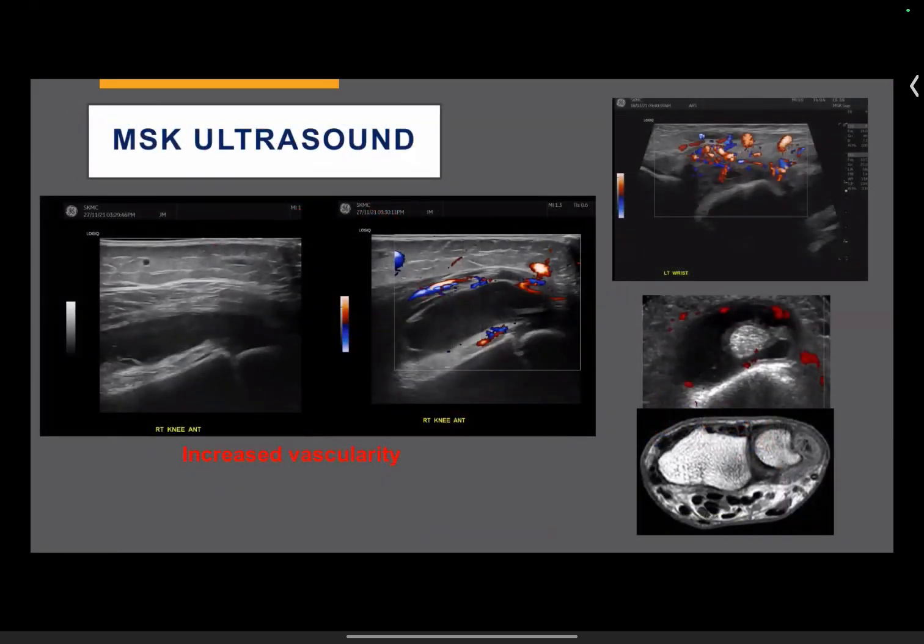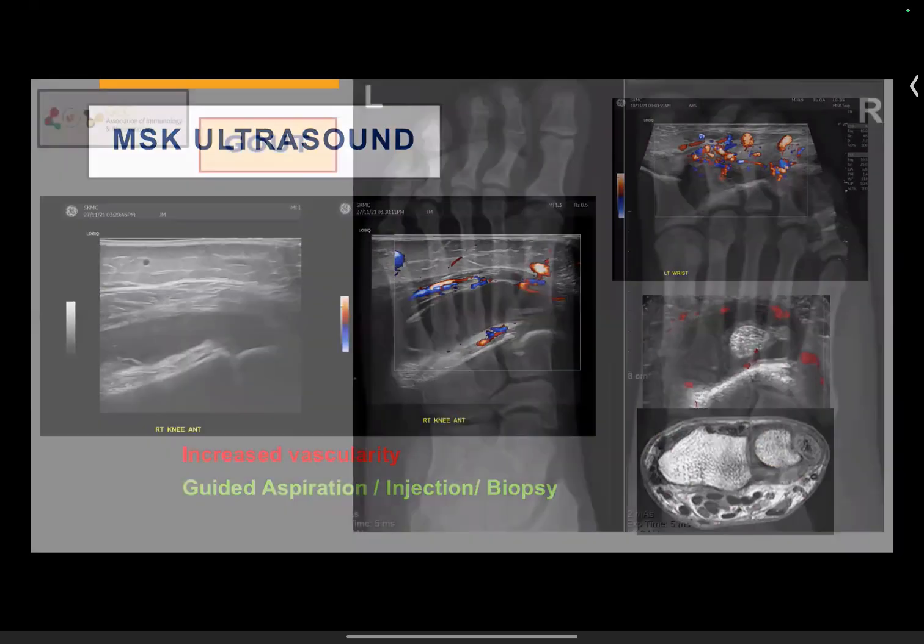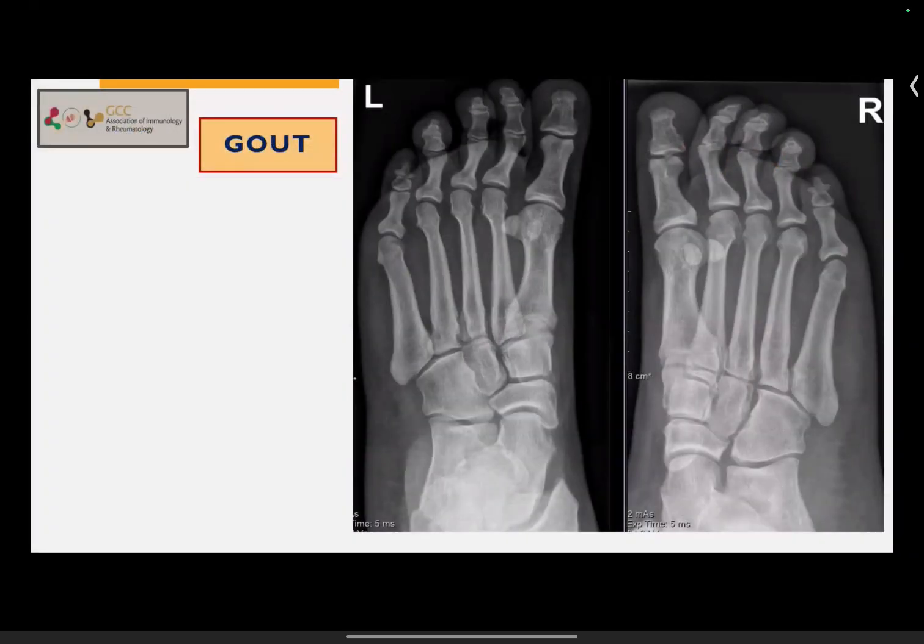Again, just showing you a few more examples there. All right, okay. I put gout there. I just presented this in one of the rheumatology meetings. The use of ultrasound, as an MSK radiologist, is an opportunity for us to talk to the patient, to take a history, and the patient will point out where the pain is. It's just our clinical input that counts.